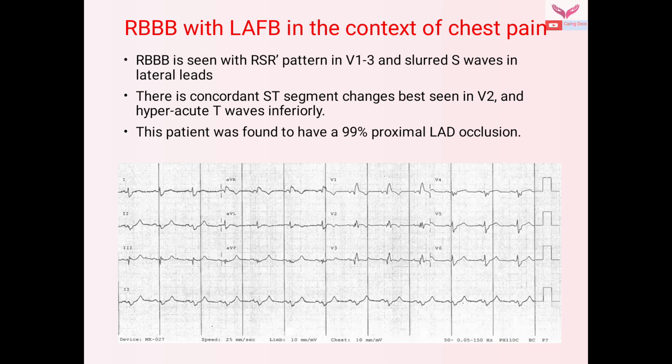Here we can see the RSR-dash pattern in V1. In V2 we can see ST segment changes, that is ST elevation, and hyperacute T waves after the RSR pattern.